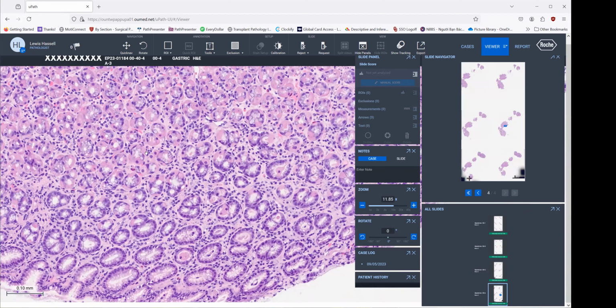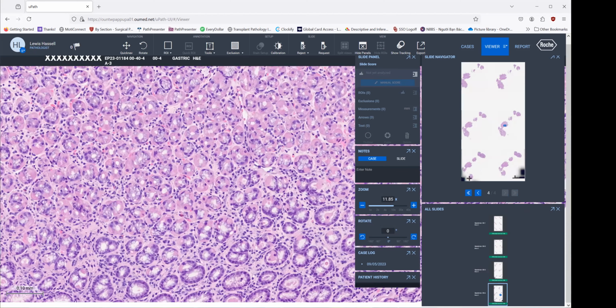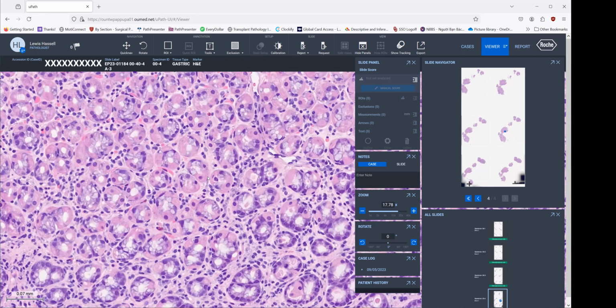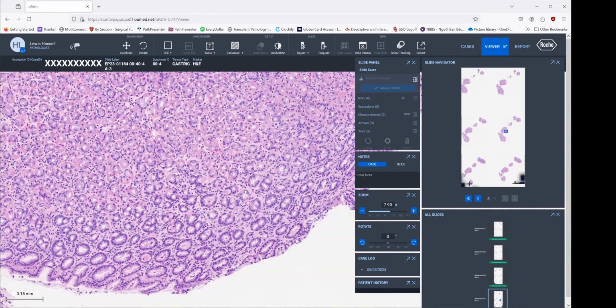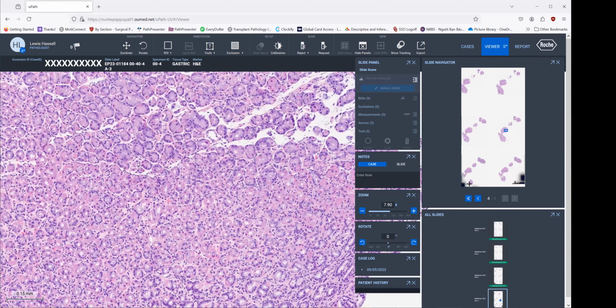Now, sometimes in the gastric mucosa, you can see features that suggest Crohn's disease. There usually will be, at the very least, a significant increase in eosinophils. This is not a significant increase. This is an increase. I think normally the gastric mucosa would have one or no eosinophils, but here in this small field, we've got 3 or 4, which is not a huge number. It's not eosinophilic gastroenteritis, but it's certainly moving up towards an inflamed gastroenteritis.